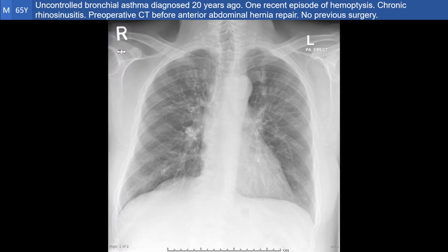The chest X-ray shows that the bronchovascular bundles are more dense and more numerous than normal, because the bronchi, which are normally radiolucent, start to have shadows when their wall is thick and when they are clogged with secretions. Bronchocele is seen here at the upper lobe.